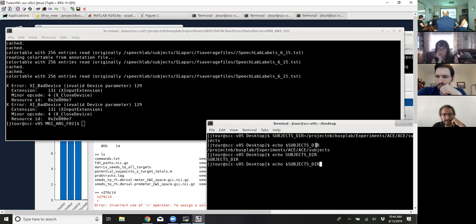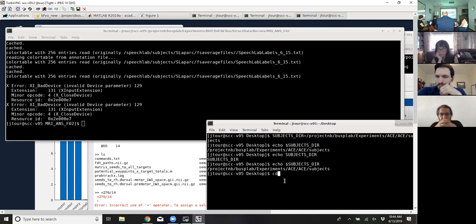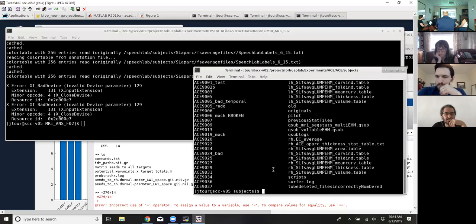So now if I cd to subject dir, I'm in that location with a bunch of FreeSurfer subject directories.